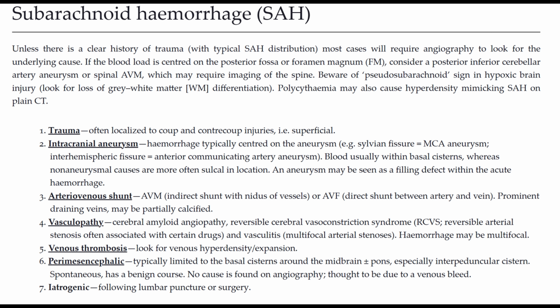Let's end with 4 high-yield reminders. 1. Aneurysmal SAH usually centers on the basal cisterns. Perimesencephalic SAH stays around the midbrain. 2. Always exclude trauma first. Location and pattern help.